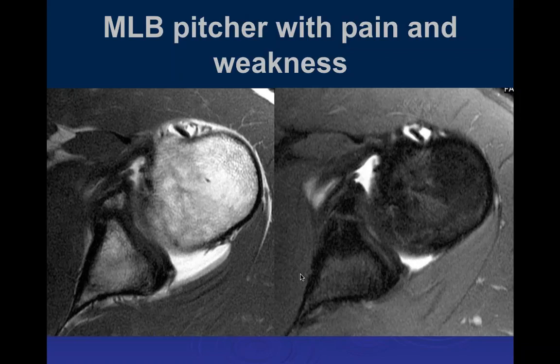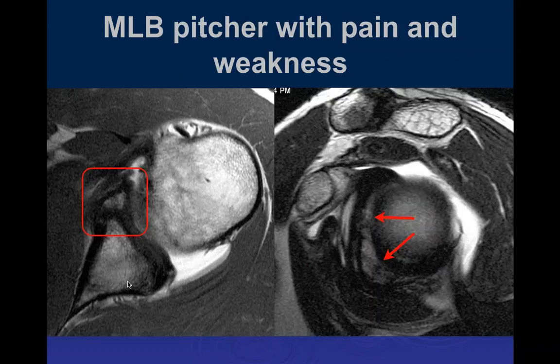So it appears that we have an anterior inferior labral tear. I think it's an osseous, I think it's a bone. Well, it could be a bony Bankart. I see a marrow signal there. It could again be a calcified or ossified anterior inferior labrum versus the bony Bankart lesion.